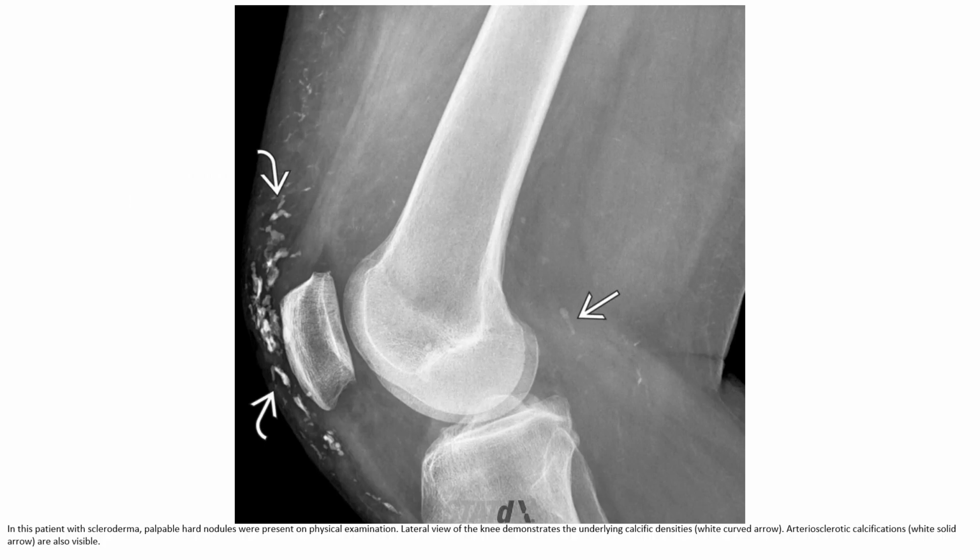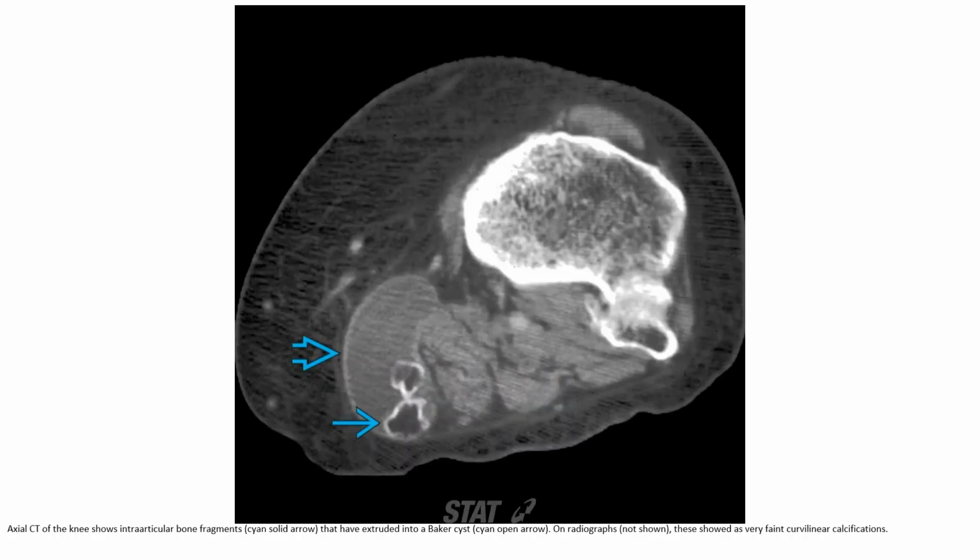So this is a case of scleroderma. This is a case of an intra-articular bone fragment and osteochondromatosis.